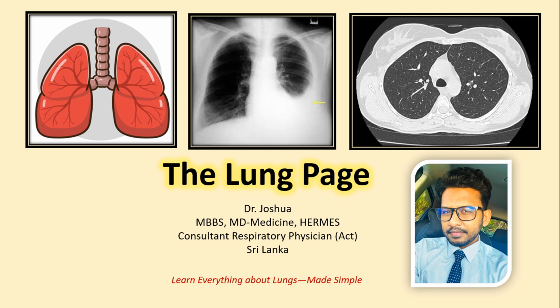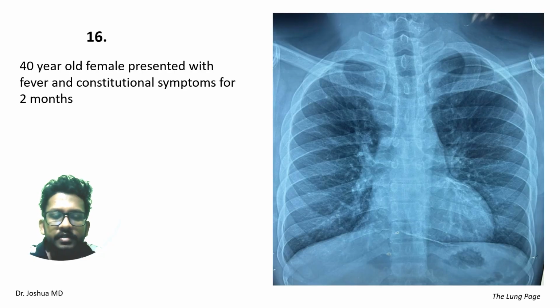Today we are going to see a rapid revision of the chest X-ray 5 images in 5 minutes. This is part 4. So first case, 40-year-old female presented with fever and constitutional symptoms for 2 months duration. So we took a chest X-ray.